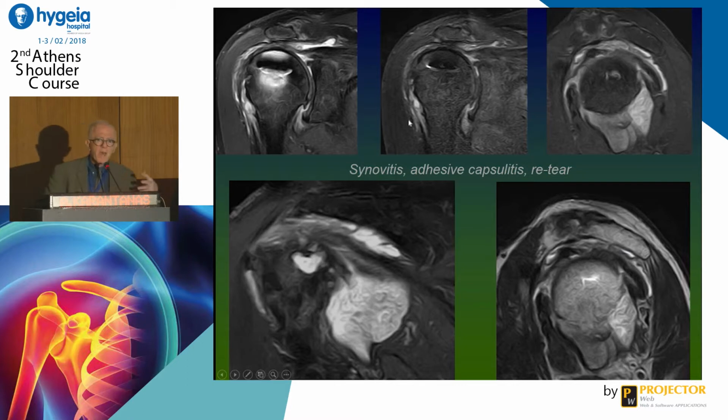In other patients, we have more than one finding. For instance, in this patient, we have a wavy appearance because of retraction of the supraspinatus tendon. You see the difference between chemical fat suppression and STIR sequence. Lots of artifacts, reduced artifacts.